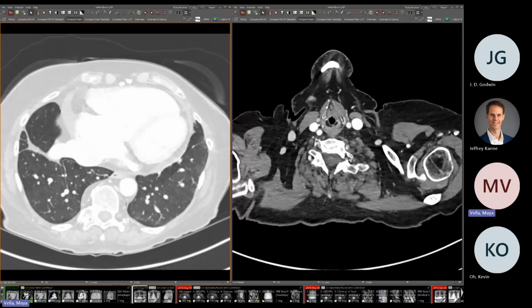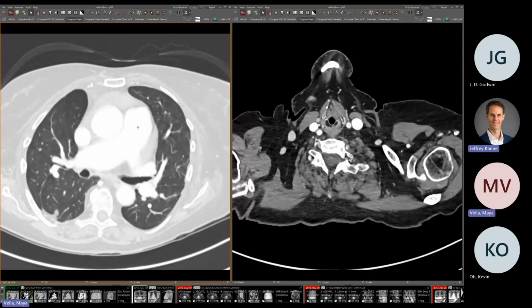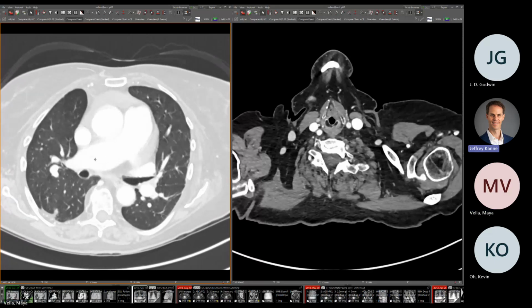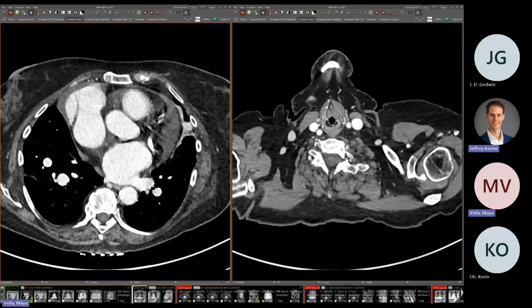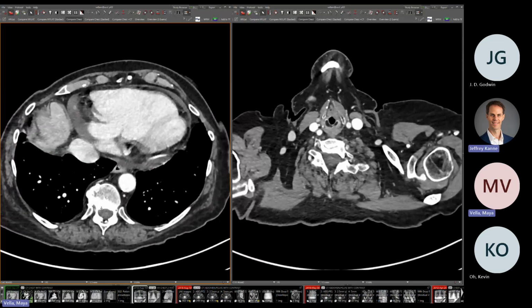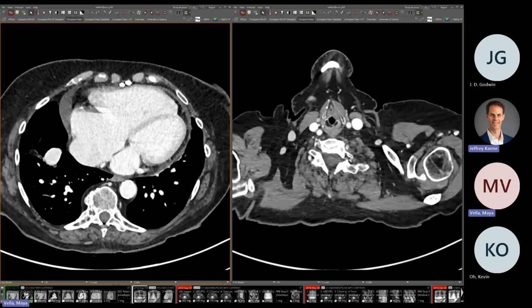That's a nice one. Anyways, I didn't see systemic arterial supply. No. Which is another common thing we've seen. Yeah, looks like. And then sometimes some weird diaphragmatic slips. But yeah, this one, that's probably why they made it to their 80s. Exactly.